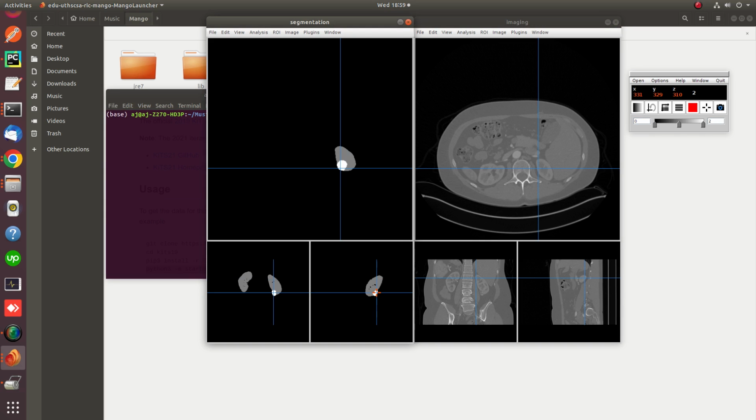Okay, when I click on the tumor portion, you can see in the window at the top right that this represents a second class. The first class is the kidney, and class 0 is the background. So your goal is to first segment the images, and thereafter classify them into 3 classes.